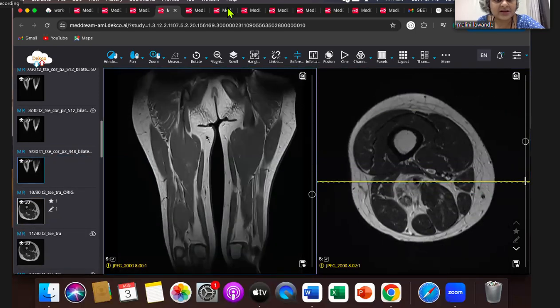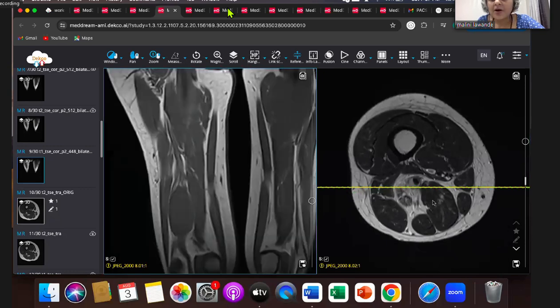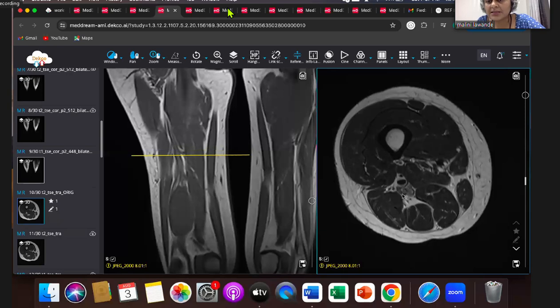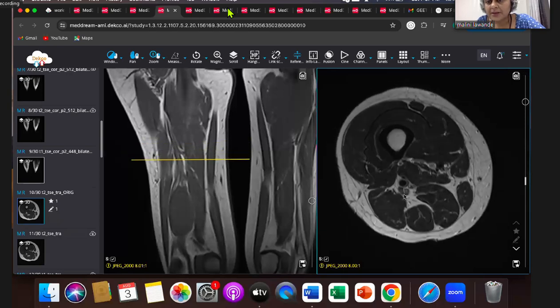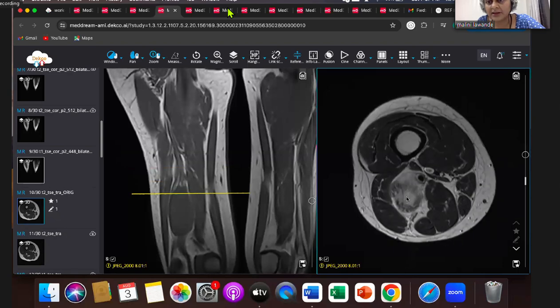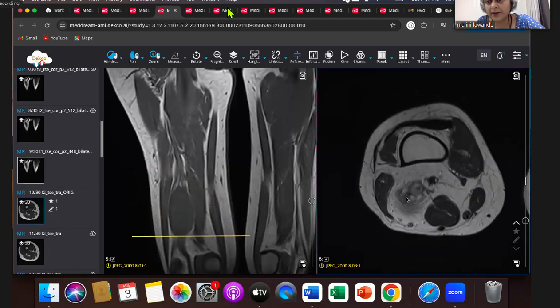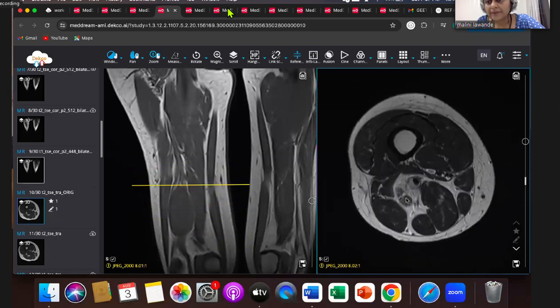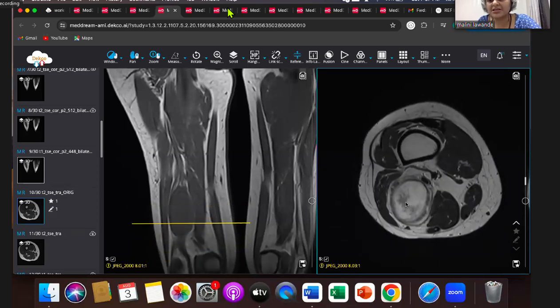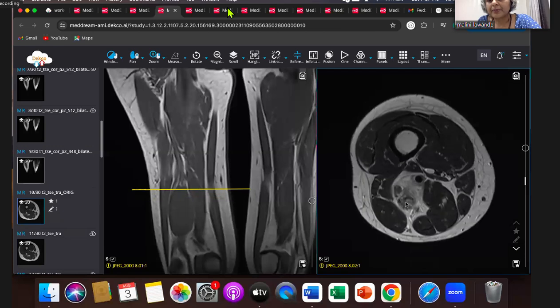Yeah, so this lesion does have few of those signs. One, it is very important to trace the nerve on axial images, because coronal and sagittal images don't tell you whether it is a nerve or not, because they can be average. So we are looking here. This is the sciatic nerve, the tibial component. As you come down, no, it's the sciatic nerve. The branching is higher up, lower down.